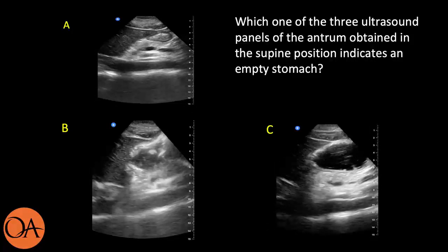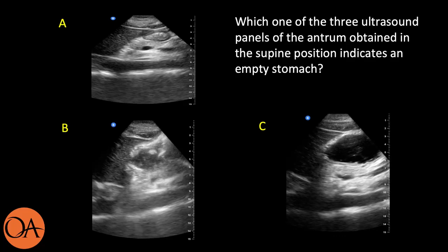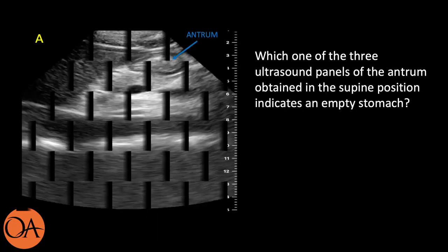Panel A, panel B, or panel C. The correct answer is panel A.